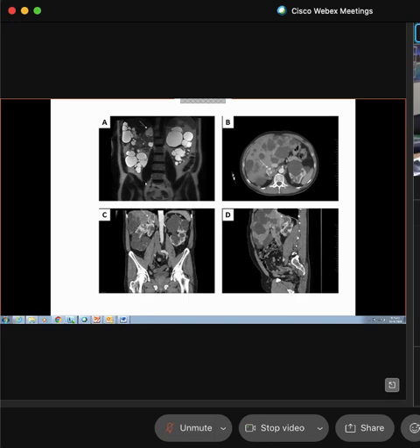Here, a little bit darker. This is an MRI. This is a CT, a little bit different. But the concept is still the same. Here we have the iliac crest, iliac crest, iliac crest. However, we don't see the vertebrae, do we? Like we see it here.